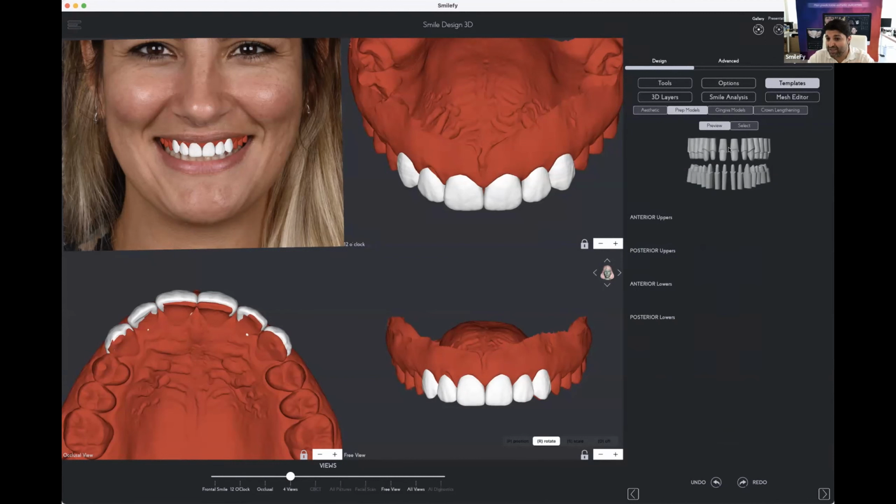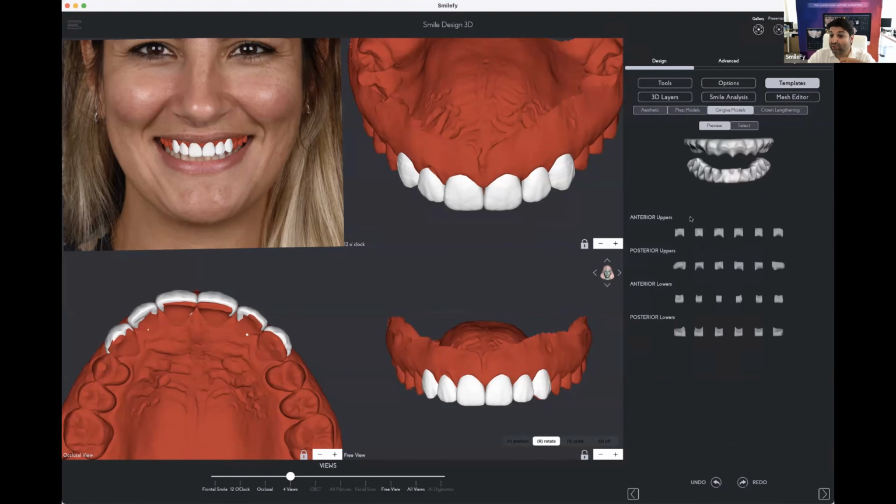You can use these dices here, and you can create with composite a model that you can then rebuild the prep. We do have Gingiva models, right? So if you create the full arch implant bridge, you can use the Gingiva, lower and upper. Or if you have an extraction and bone loss, for example, you can use the prosthesis Gingiva for this tooth, upper and lower, just to fill out the space using one piece of the prosthesis Gingiva.